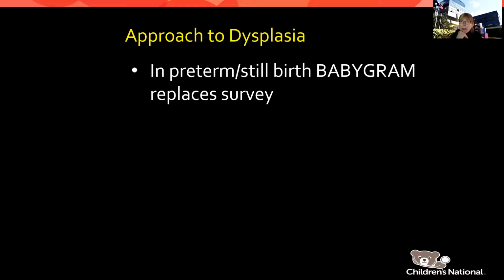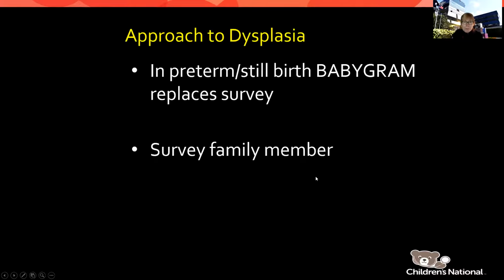And then for preterm infants, small infants, I'll certainly sometimes do a full large field of view of the pelvis to the feet, or chest, including the spine. But you don't want to get a large field of view including both arms and feet, because it's a bed of radiation and you're not getting optimal positioning.